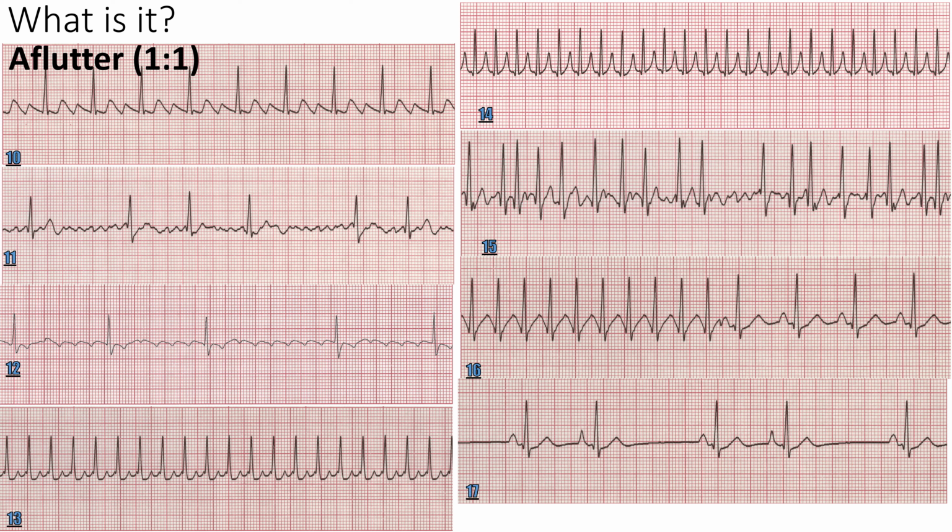And the next one looks like they're trying to flutter. Looks like it could be flutter. Is it flutter or fib? It's hard. You have to maybe get a 12 lead to see if other leads really corroborate it. I say just AFib. If you have to guess, that's usually the law of averages. If it's irregular, you really can't tell. Like if you're looking at between 11 and 12, definitely 12 is flutter, something you could really write home about. All right. So number 12 is A flutter.